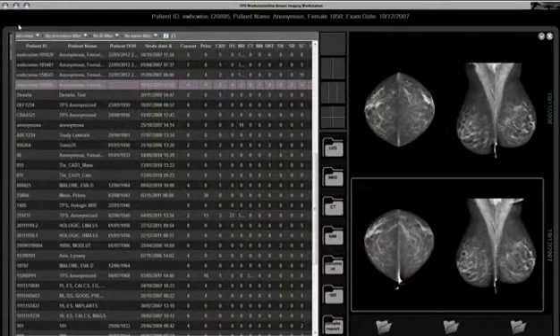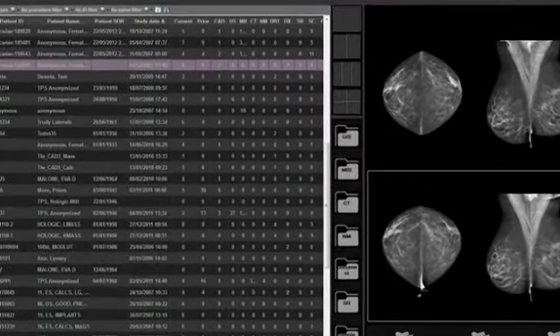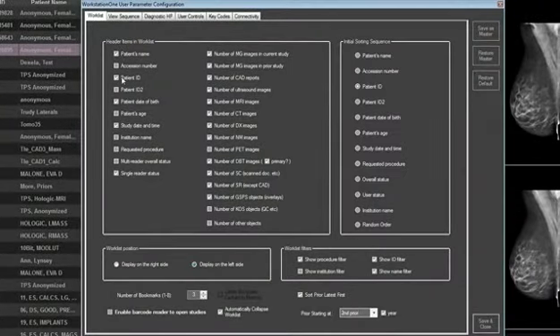To change user settings, click on the middle button on the top left of the navigation window. Choose what information you would like displayed in the work list in the first tab. If you have tomosynthesis images, choose Primary beside DBT images if you would like to see the tomo version of each view before the normal 2D view.